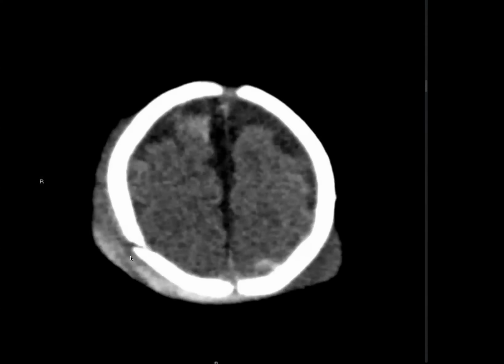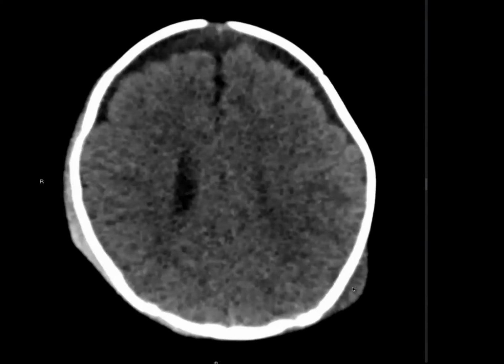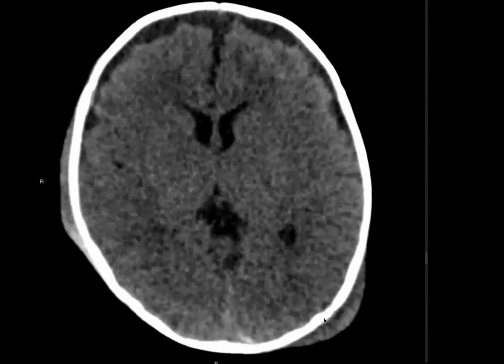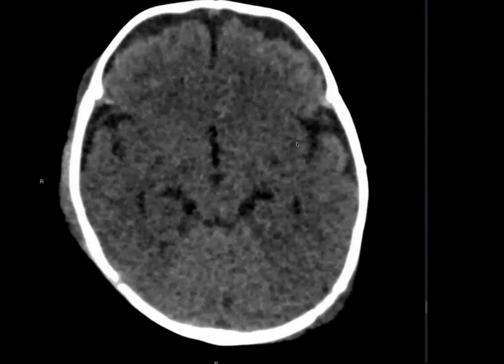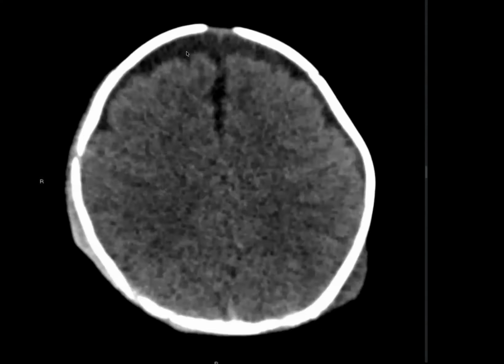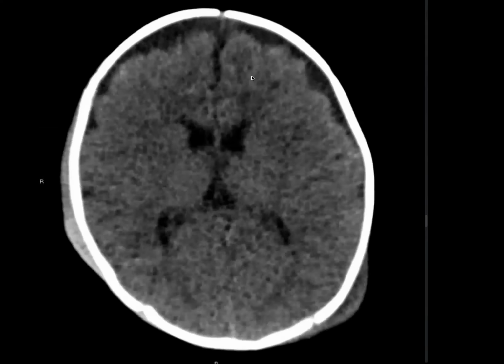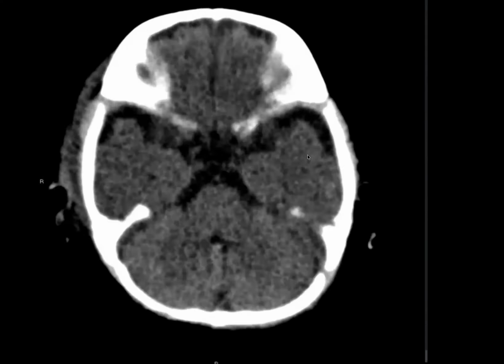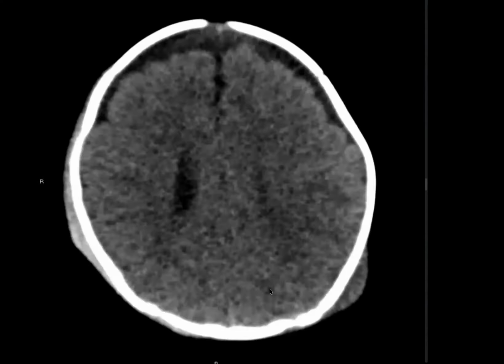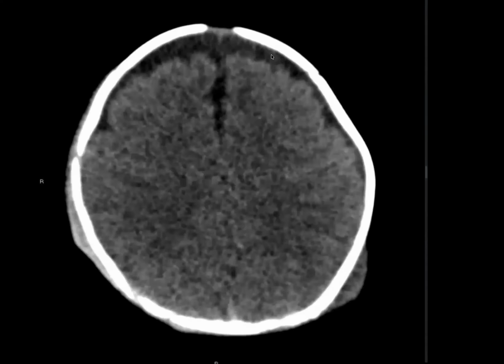So yeah, fracture lines, they are coinciding with, instead of saying soft tissue, you can be a bit more definitive. These are extracranial hematomas or scalp hematomas, whatever you want to call them. And there are multiple of them. And yes, quite rightly found the enlargement. It can be benign. We have an entity called, I think, BESS. Keep forgetting, I don't do pediatrics a lot. But in this case, where you know there is history of suspected injuries, you cannot ignore it. Then this can be hygromas.